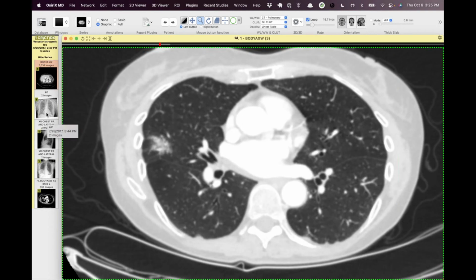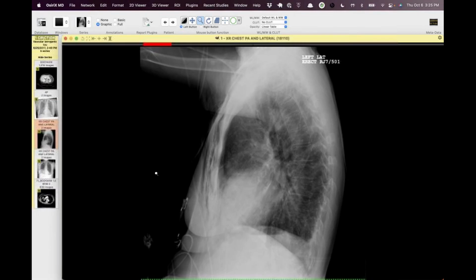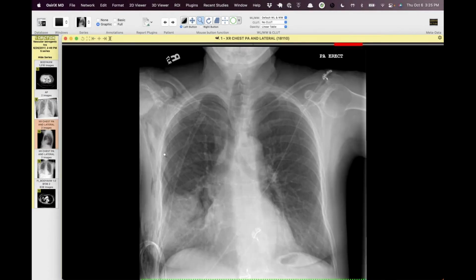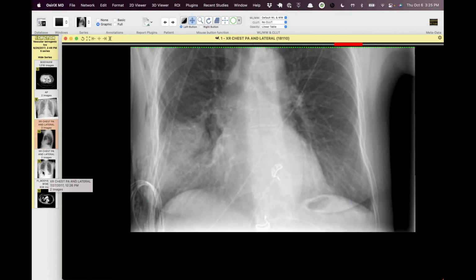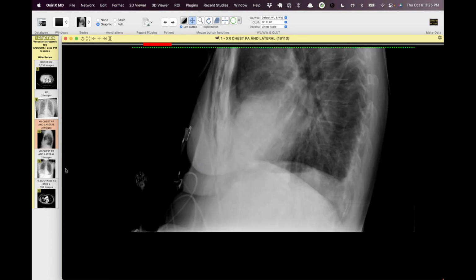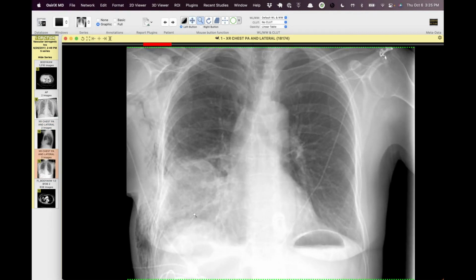All right, and then this last one, also vascular, but let's see if I can get this in the right order. This is a patient who had this in the lateral segment of the right middle lobe, and it's a little adenocarcinoma. It had been growing, and so they went in and did a right middle lobectomy. Here you can see the immediate post-op radiograph where there's a chest tube, a tiny little pneumo, a little bit of volume loss there. And then I don't know, let's see what the time frame was. This is the next day.